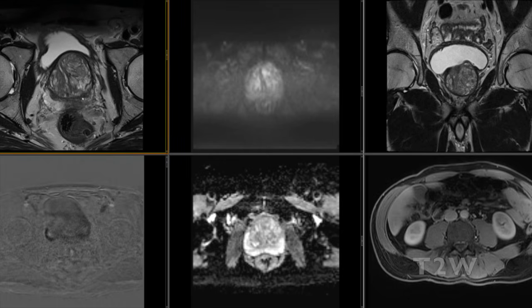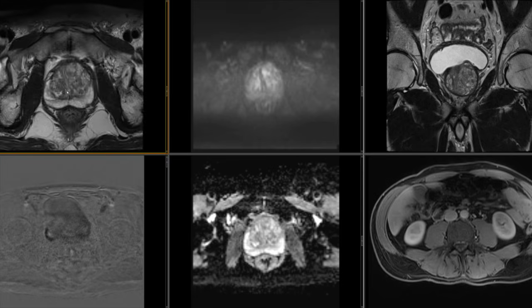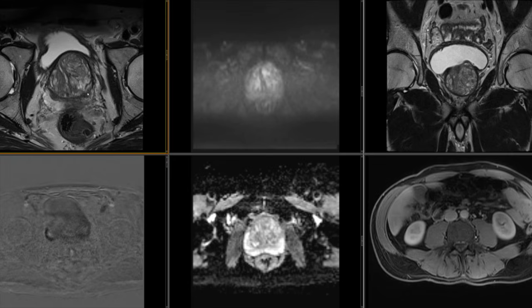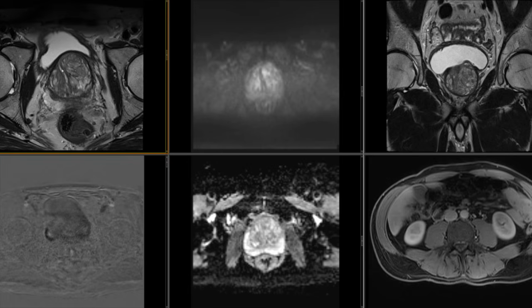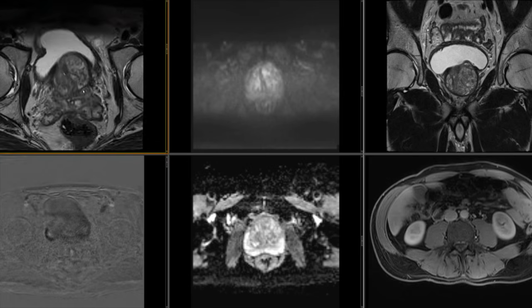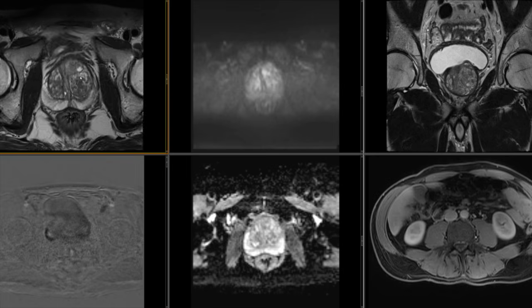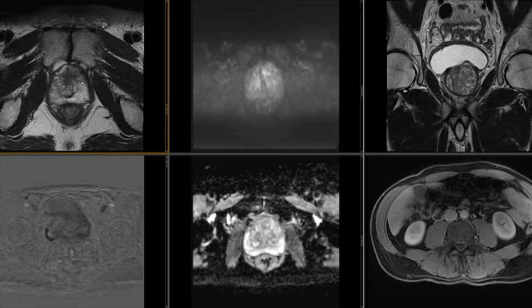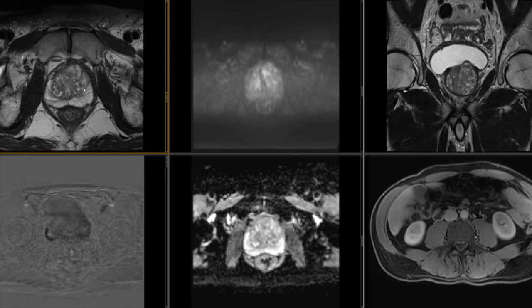Then I generally look at the T2 weighted images for anatomy of the prostate, looking at the TZ and PZ. So starting with the TZ, I'm looking at these BPH changes on either side and looking for anything that stands out and anything that looks like cancer. So these are all BPH changes here, including glandular BPH changes and stromal BPH changes, but there are no suspicious lesions here that would match the category 4 or 5 T2 weighted score in the TZ that are suspicious at this time at least.